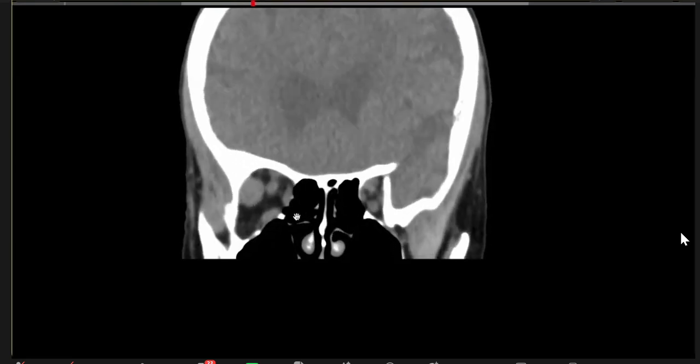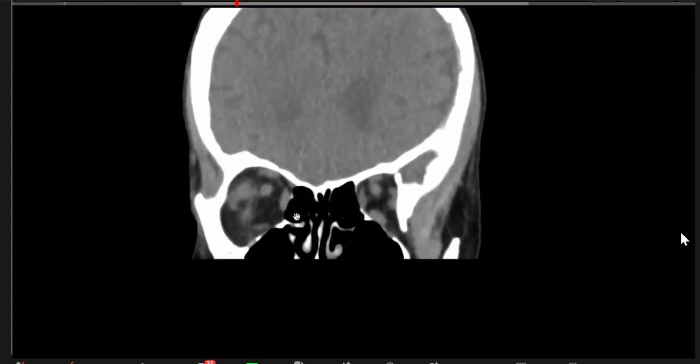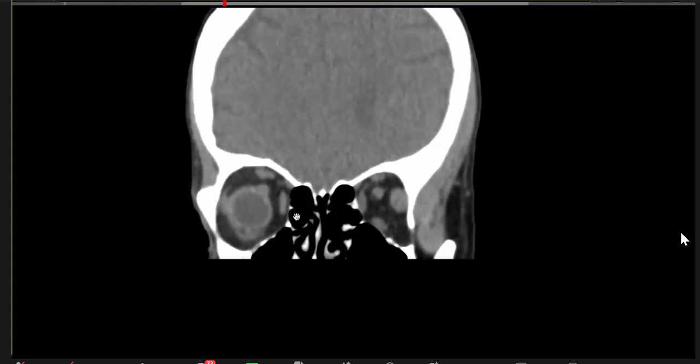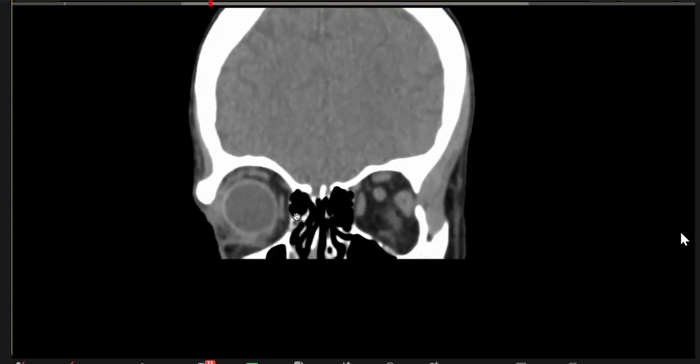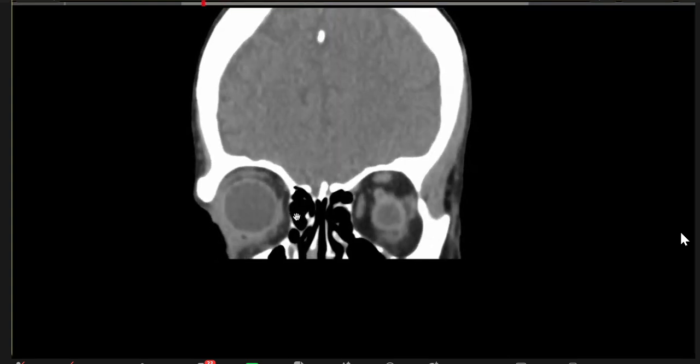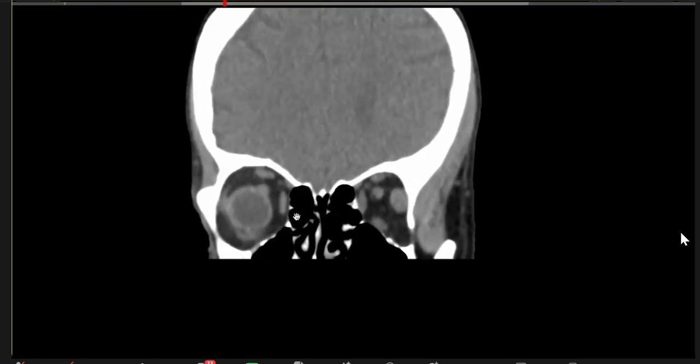Madam, can you hear me? Yes, sir. Okay, you have done very well. What is your conclusion? Sir, my conclusion is that I'm worried about two things. One, it is likely thyroid related orbital disease. I'm calling it thyroid related because the myotendinous junction is not involved. But the lacrimal gland is enlarged.